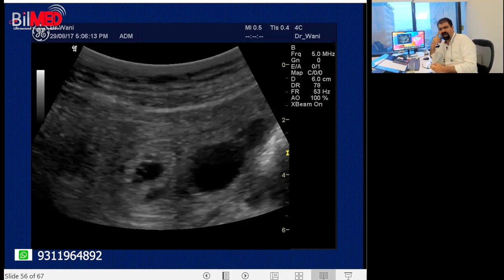I'll be fooled if I do not think of all lines of ectopic now. Again, repeating, there should be some knocking factor on my head. Then only will my neurons think along that line. And that knocking factor is the etiology and the clinical presentation, which we discussed. Now, what can this be and what can this be? Don't look inside this structure. Tell me in your comment boxes what this is and what this is. The patient is tender, with mild spotting.